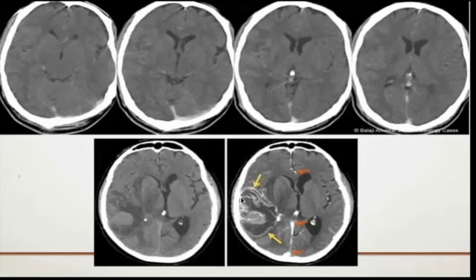It's well defined. A mass, perfect. Any idea what kind? Is this like a tumor? Is anyone thinking this is more of a tumor? It's a tumor, okay. Because you're looking at a mass that's causing a midline shift, and it's surrounded by vasogenic edema, especially visible here on its borders, and going on around the borders here. You see the vasogenic edema.